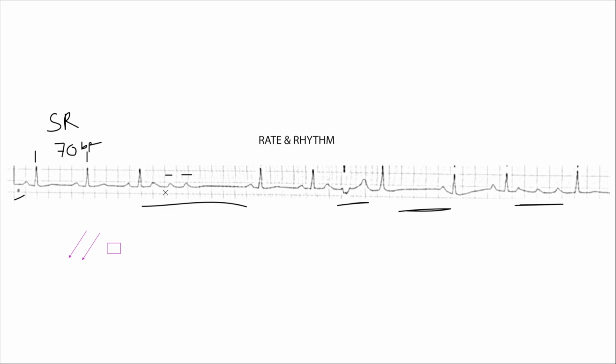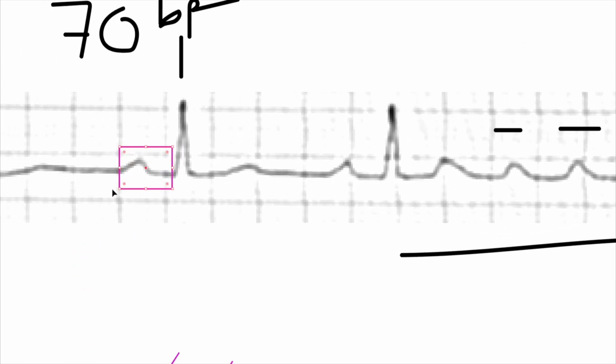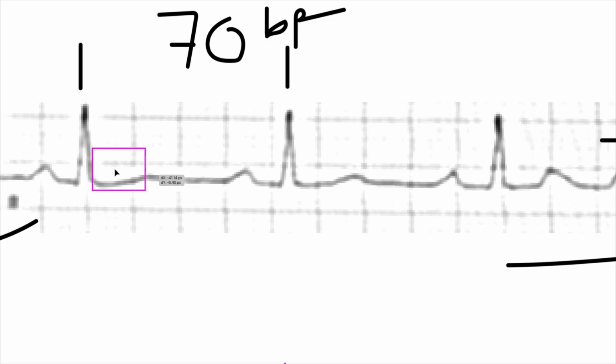Now, moving on. Let's take a look at the PR interval. The PR interval, I'm just going to grab it right here. Going to zoom in a little bit. Grab it right here. That is, I'd say, identical to that one. And it's almost identical to this one. This one is a little bit quicker. So this one happened a little bit more quickly, but I am not sure. So we might be looking at some sort of a block.